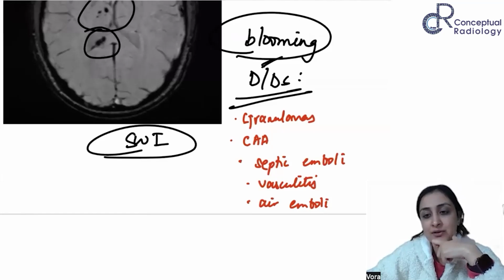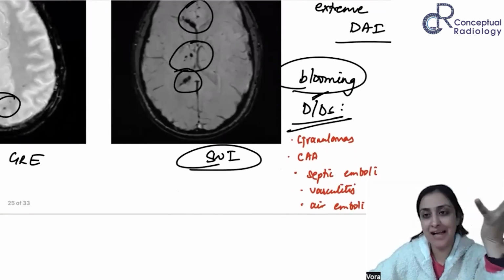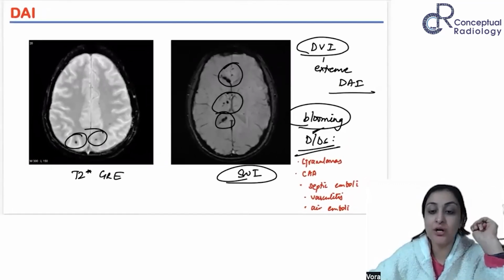Shouldn't calcified granuloma appear more white? No, no. We're talking about MRI, right? We're not talking about CT. So calcium and hemorrhage, both of these are going to induce susceptibility. All right. That's what you want to remember.